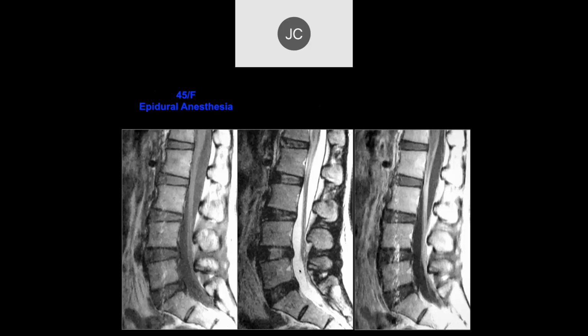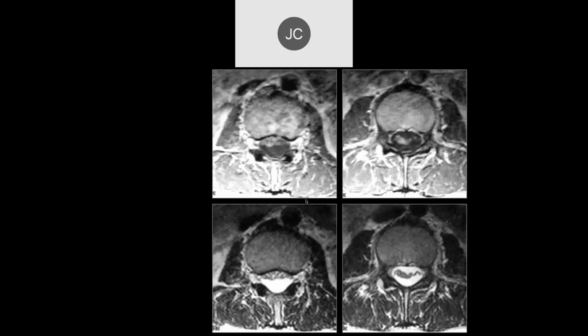Yeah, so it looks like the cauda equina is being pushed anteriorly. Okay, so there must be some, and it looks like fluid behind it. So it looks like maybe some fluid was injected in the, yeah, and we don't really see the thecal sac, or separate nerve roots here, which is classic for what we're talking about here.